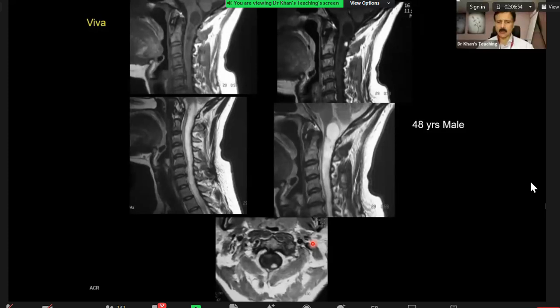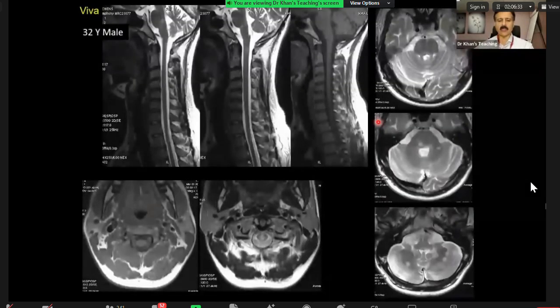A hemangioblastoma of the cord? Excellent. So this is a classical hemangioblastoma. Please remember that they might not have any cystic component. So the lesion itself, the tumor itself can have a cystic component, and then there can be a secondary syrinx also. So this is quite classical. And we have seen quite a few of them when we were covering phakomatoses.